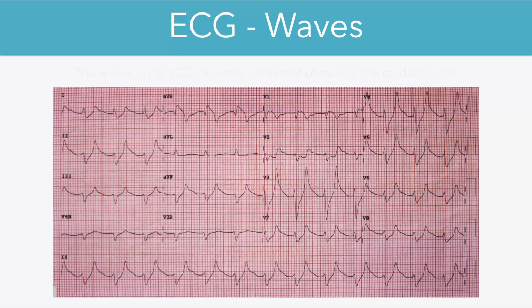Let's take a look at one practice question which has quite a few different wave abnormalities. If you want to, you can pause the video and try to find the abnormalities and work out the most likely diagnosis in this case.